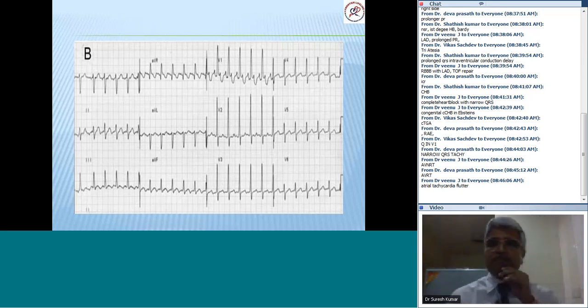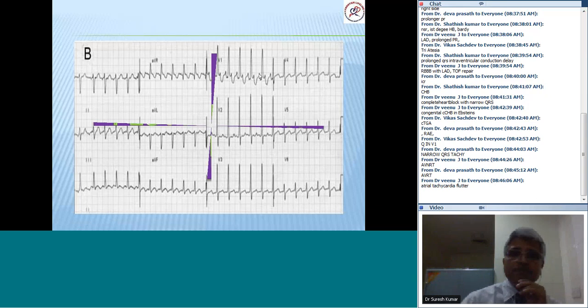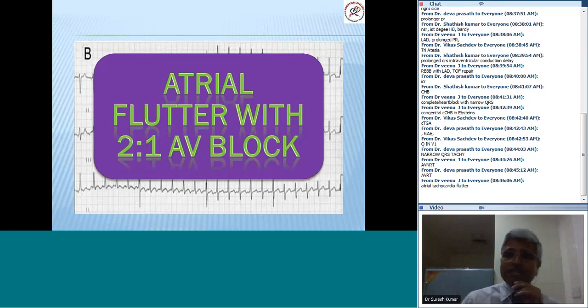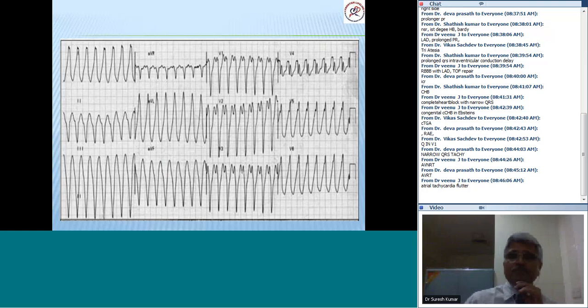Yeah, you should definitely think of atrial tachycardia in this, and I think your problem once again is not having the ECG in hand. If you see here, see these spiked complexes. That makes it very likely to be atrial flutter. So this is atrial flutter with 2:1 AV block. Remember, whenever you diagnose atrial flutter, you have to say what is the AV conduction ratio. Diagnosis here.